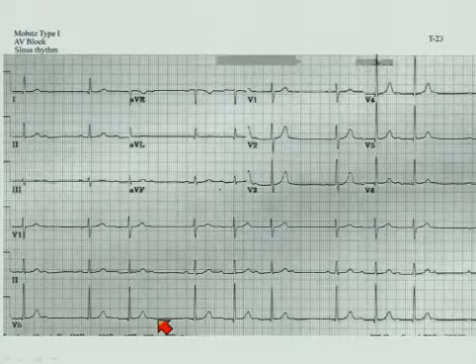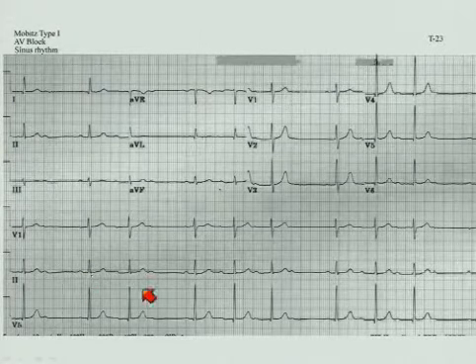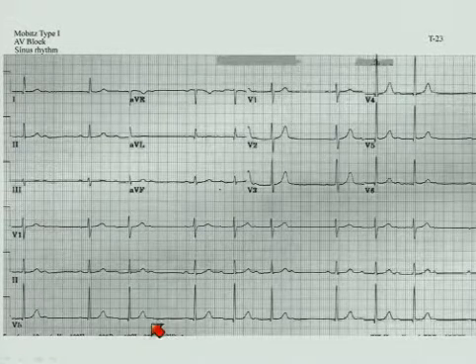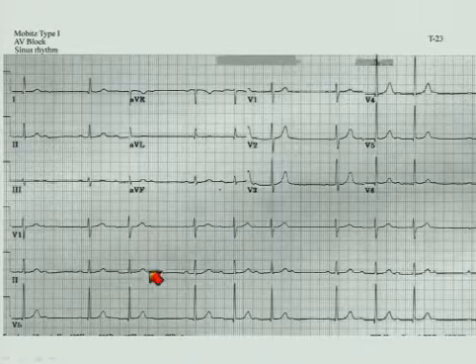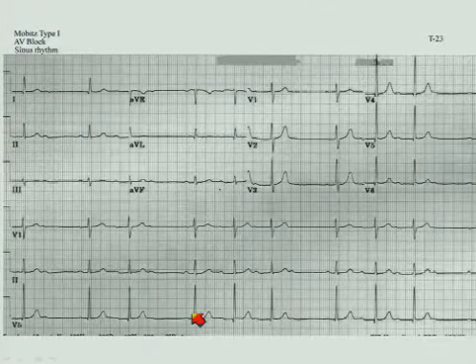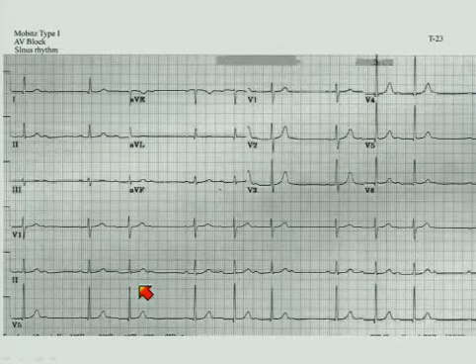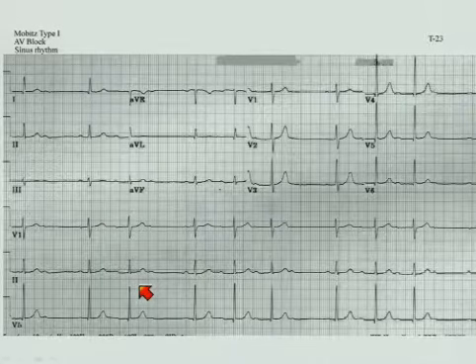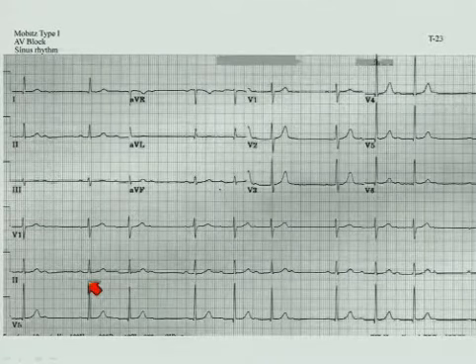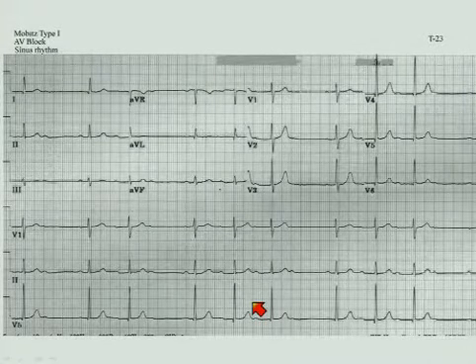Here's point number 3 that I want you to remember. Anytime you have an irregular rhythm, we said to look in the T wave to be sure there's not an ectopic beat, but even before that, always start with the P to P interval. And if you start with the P to P interval, you'll see this is perfectly regular. And so this group beating that you see here could be due to several things. Group beating can be due to blocked APCs, to sinus node exit block, to a variety of things. But you see that the P to P is perfectly regular, and therefore the PR is gradually prolonging, and so this is obviously a straightforward Wenckebach, Mobitz type 1 block.